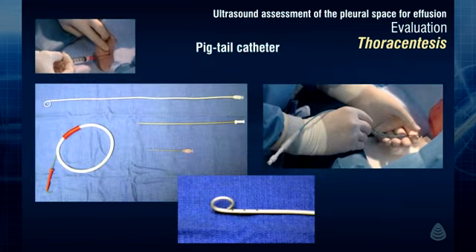When drainage is performed, we will often use small pigtail catheters that will be inserted based on the Seldinger technique. A variety of sizes and models from various companies exist. We will conclude this section by reviewing a few clinical cases.